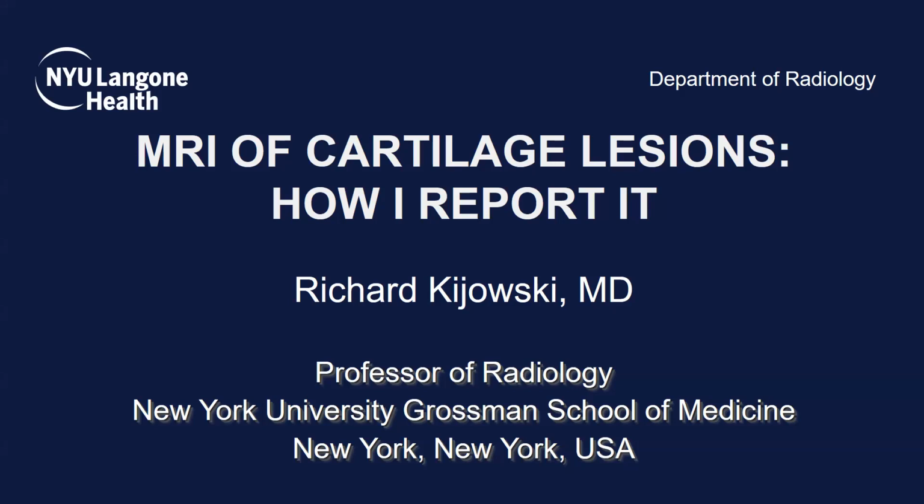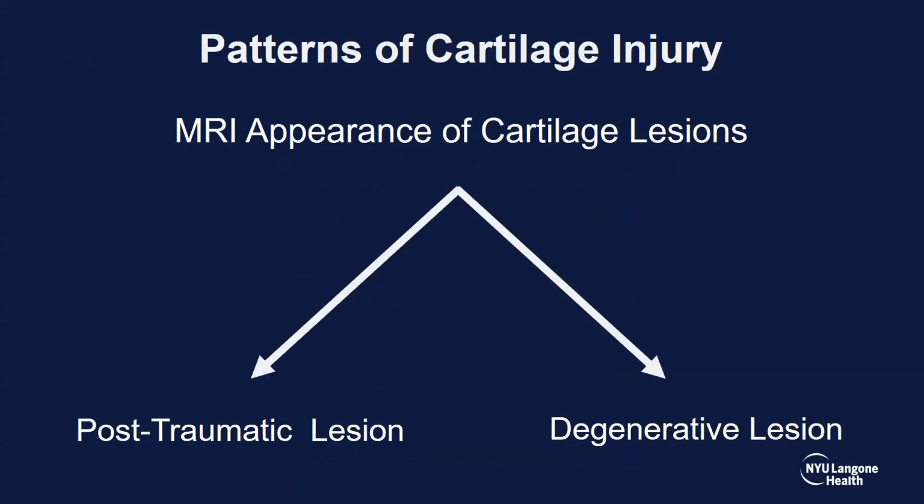I would like to first give a short PowerPoint presentation describing how I dictate the appearance of cartilage lesions in my report, and then illustrate using multiple case examples. Now, the MRI appearance of a cartilage lesion depends on whether the lesion is post-traumatic or degenerative in origin.